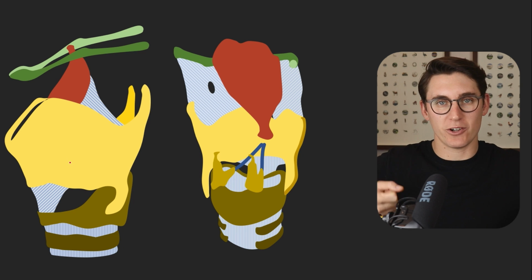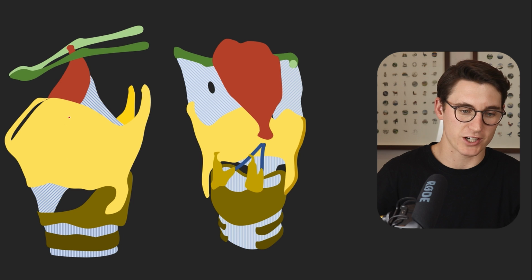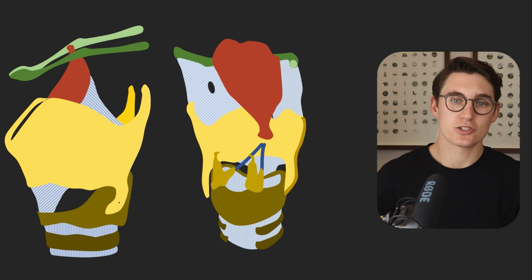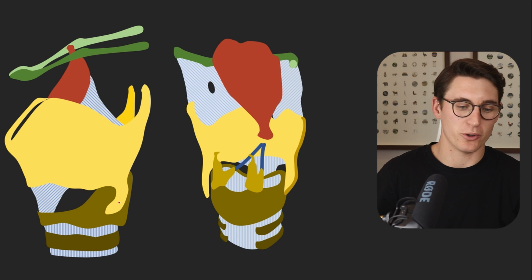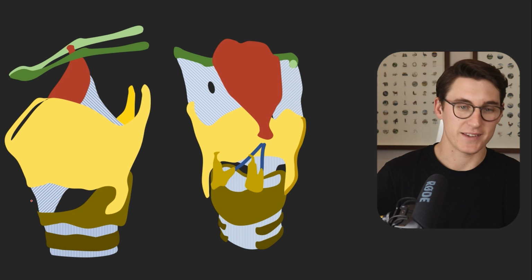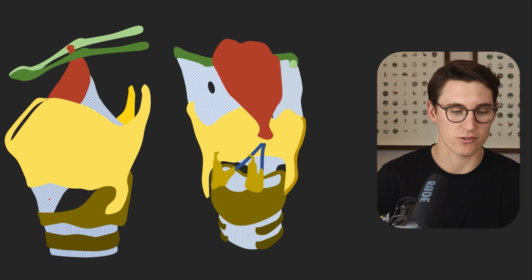You can think of that hyoid bone as holding up all these structures. There's membranes connecting each and every one of these components. So the top of our larynx is that hyoid bone, and the bottom of our larynx is this cricoid cartilage from which everything stacks on top of it. Between our cricoid and our thyroid cartilages, we've got this cricothyroid membrane, and if we were to make an emergency airway, that's the membrane that we would need to cut through.